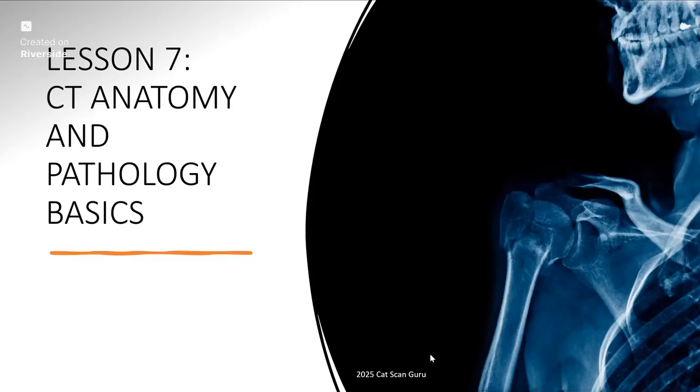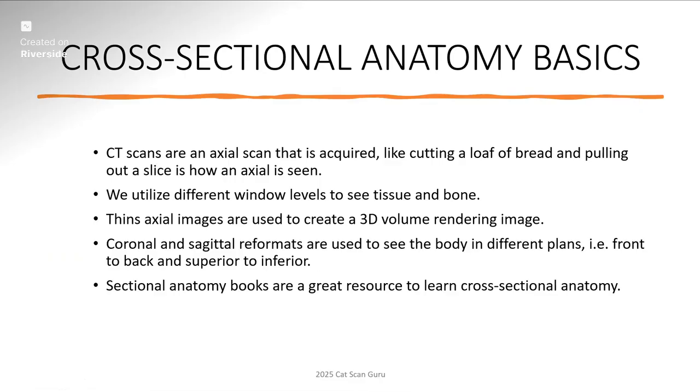In this lesson, we are going to be talking about CT anatomy and pathology basics. I am just going to give you a rundown of some basic anatomy and pathology, just some concepts that you need to know while navigating your CT training. All right, so this is your cross-sectional anatomy basics.